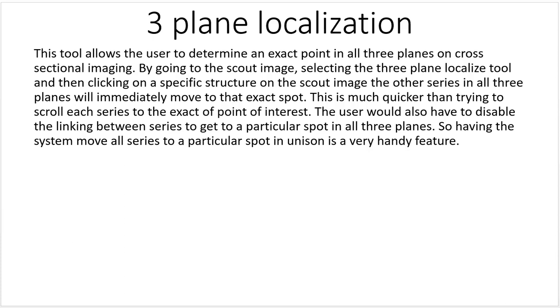So I want you to visualize a 4-up image. And in the upper left corner you've got the Scout. In the upper right you've got the axial. In the lower left you've got the coronal. And in the lower right you've got the sagittal.